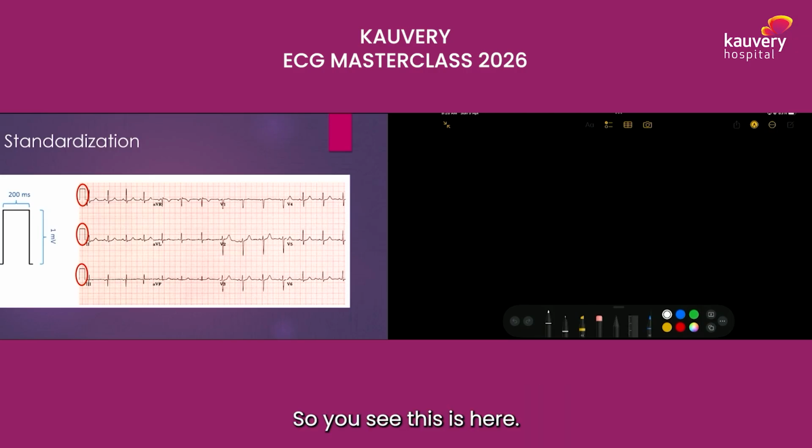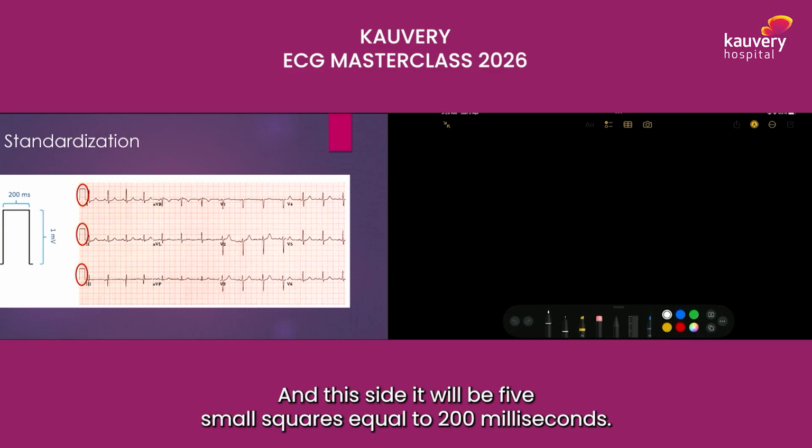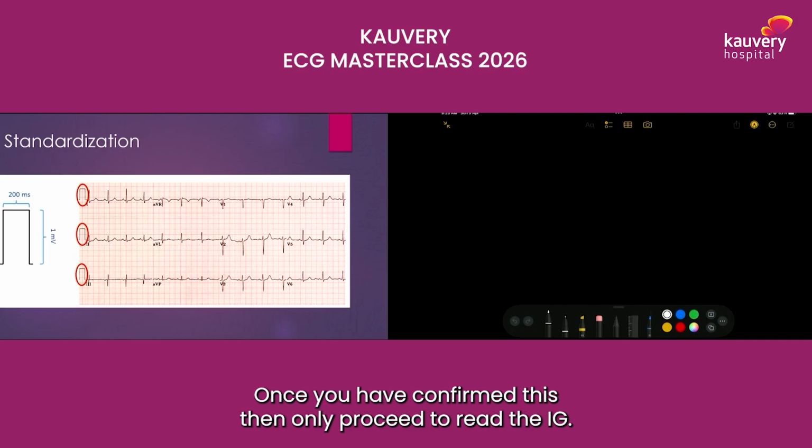So you see this ECG. In every ECG there is a standardization. If it is taken properly, it has a standardization before the traces start. This 1 millivolt is standardized, equal to 10 small squares. And on this side, 5 small squares equal 200 milliseconds. Once you have confirmed this, only then proceed to read the ECG.